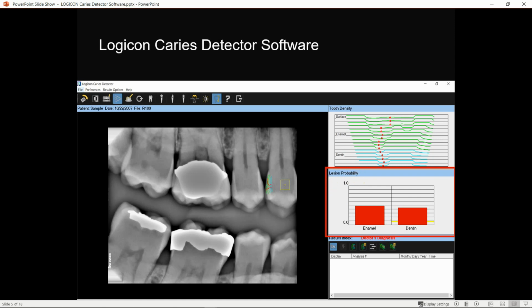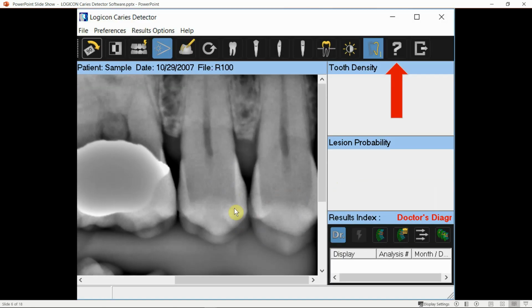This was a quick little overview. Notice how the image is its normal size as if you had taken it, but if you double click the image, it enlarges in the software, and then you're allowed to pan around. If it's early on with you utilizing this tool, understanding the do's and don'ts is imperative, and that's available to you through this help icon.